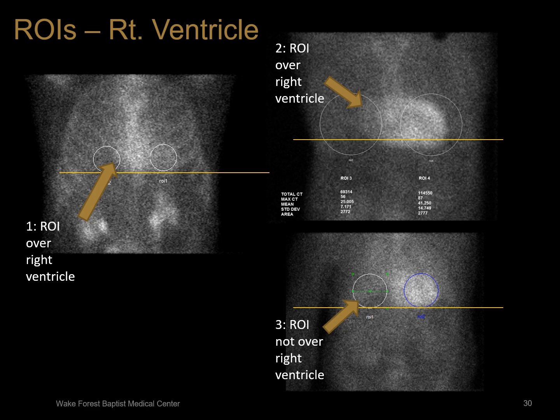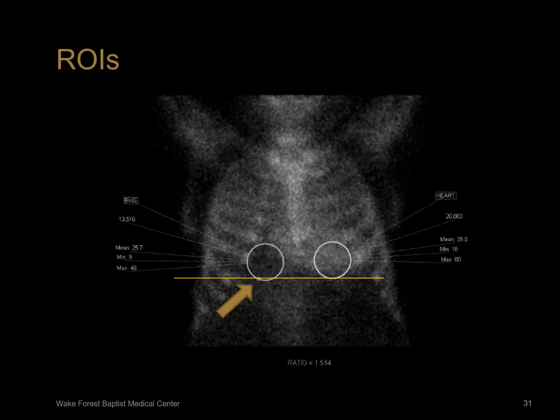And then the last region of interest, they look like they're on the same horizontal line. They're a good size and probably don't include the right ventricle, so that one looks good. On this region of interest analysis, you can see that the bottom of this one goes a little bit below the horizontal line, so it'd be probably good to move it up a little bit, and then you would be getting more of an exact heart to contralateral side ratio and not include the liver.